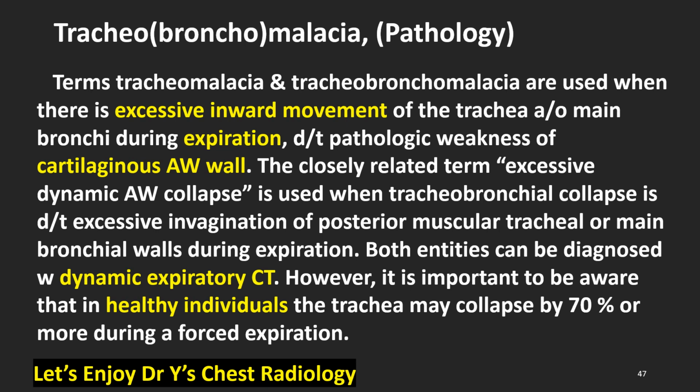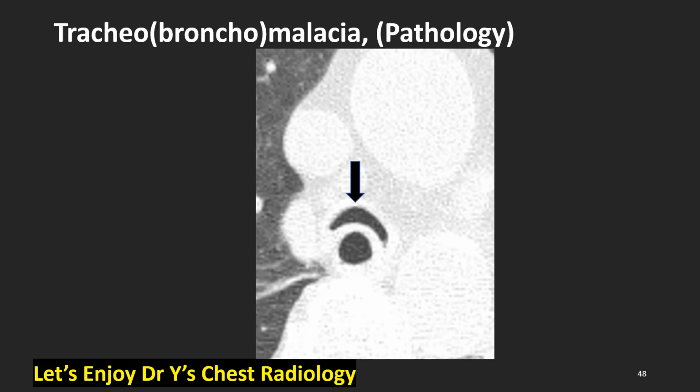Both entities can be diagnosed with dynamic expiratory CT. However, it is important to be aware that in healthy individuals, the trachea may collapse by 70% or more during a forced expiration. Tracheobronchomalacia, pathology. Arrow indicates tracheomalacia.